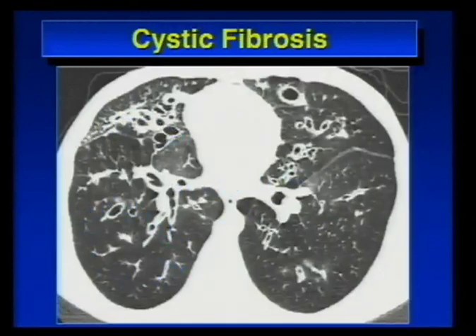How do I know this isn't cystic lung disease? Well, first of all, the walls are very thick. Usually in cystic lung disease, they aren't this thick. The other thing is you can often see branching, like in this particular example, there's a branch right there. And you can see elongation. There's a branch right there too, and you can see elongation. Look how elongated that is. You don't see that with cystic lung disease.